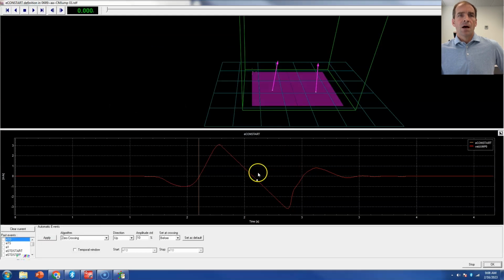Awesome. Now the next question it's going to ask is, when does the concentric phase of the jump start? At this point in analysis, all of the information it wants to know should work okay. If we get the first 4 markers right, toe off, toe strike, beginning of the jump, end of the jump, it should be able to put the other pieces together. But if there is going to be a problem, it's often here.